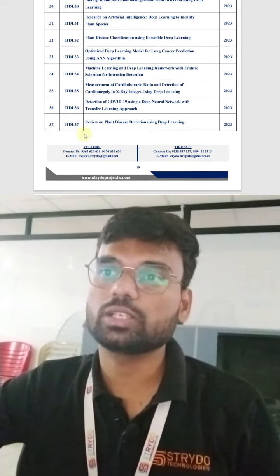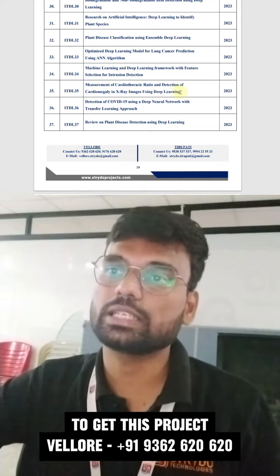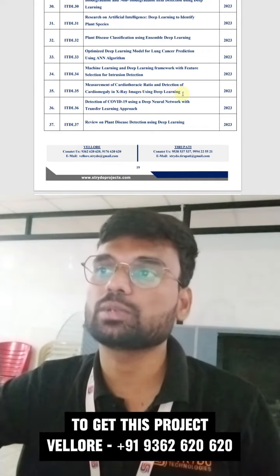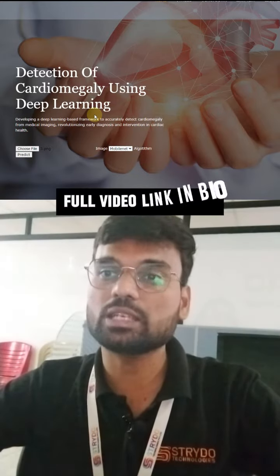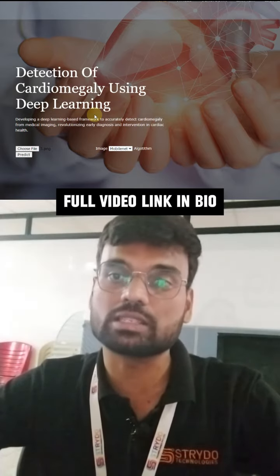Hello guys, today we are going to explain the measurement of cardiothoracic ratio and detection of cardiomegaly in X-ray images using deep learning. So this is the front end part for the project. Our project name itself is saying that it is a deep learning based framework to accurately detect cardiomegaly from medical imaging, revolutionizing early diagnosis and intervention of cardiac health.